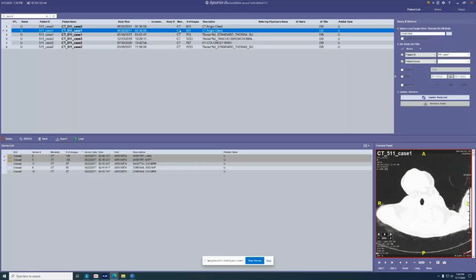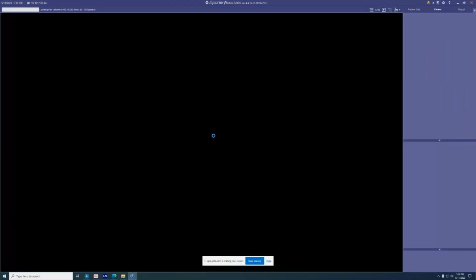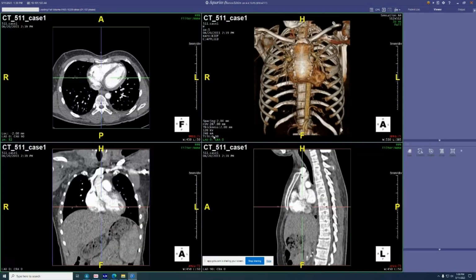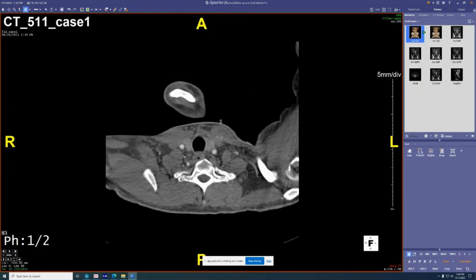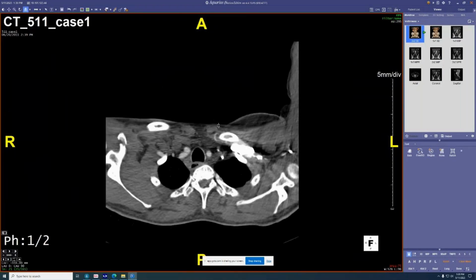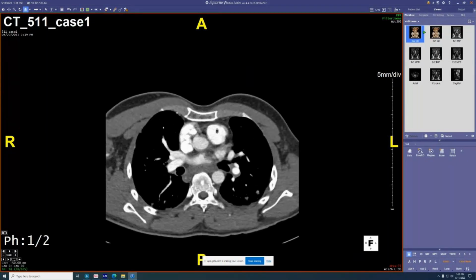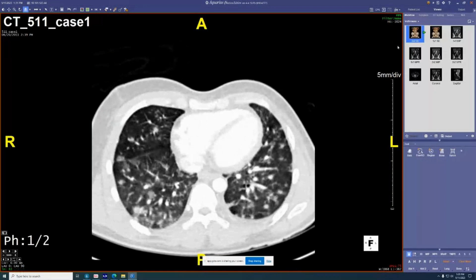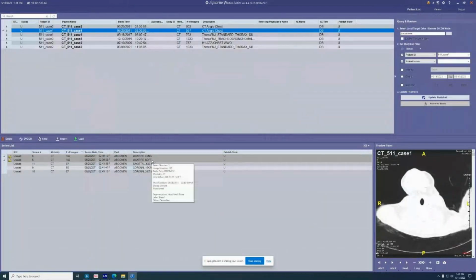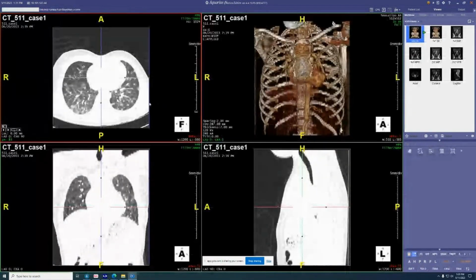Okay, real quick. Oh, it downloaded. So this is an interesting case of a young kid with Kabuki syndrome, which gives you some weird facial anomalies and mental retardation, and is also associated with coarc, which he does have, that's been repaired. What's interesting here are the parenchymal nodules. Do I have a lung window? That's really not pretty looking.